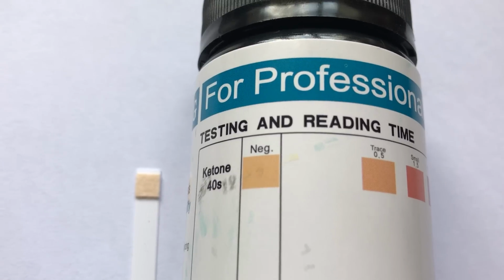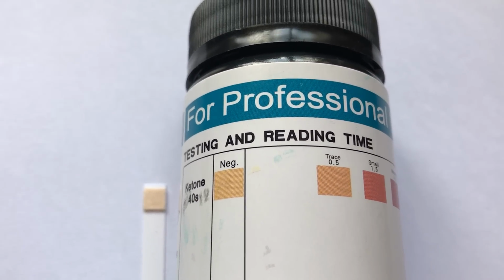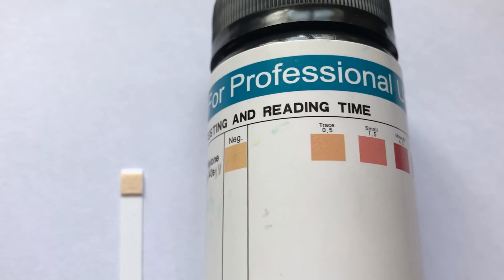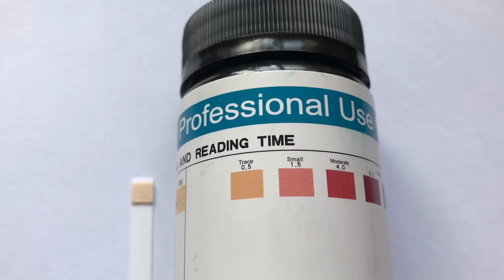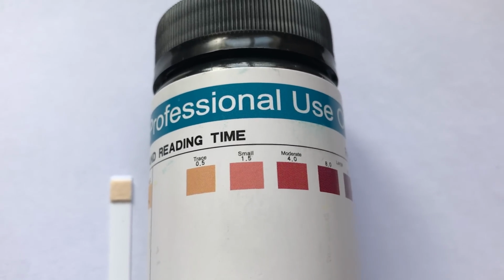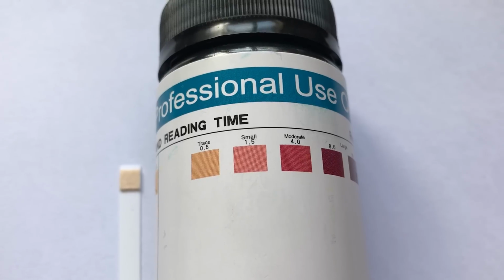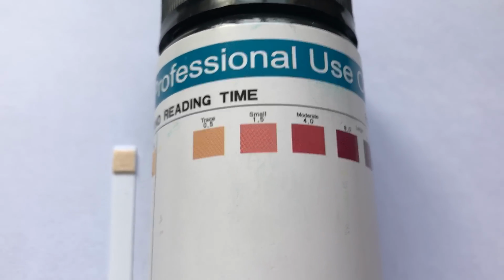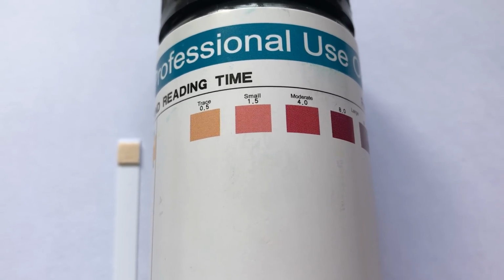On the back pad here, you'll see a dry negative result test strip, and that relates to a negative pad colour, which indicates, for the majority of healthy people that aren't breaking down fats into ketone bodies, that it is normal to have only negative or at very most a trace of ketones detectable in your urine at any one time. For the majority of a 24-hour period, if you're eating a normal healthy Western diet, even if you are on a calorie limited diet, if you're not breaking down significant ketones, the level of ketones in your urine is going to be either negative or at most a trace.